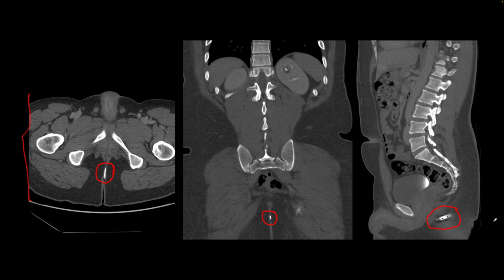trying to hide in their gluteal fold, and this was a scan on an inmate, and inmates frequently try to hide sharp things in their body parts to try to escape or make some weapons out of these razor blades. And so for these patients, we have to be very careful in evaluating any hyperdensities and evaluate the images in all different planes.